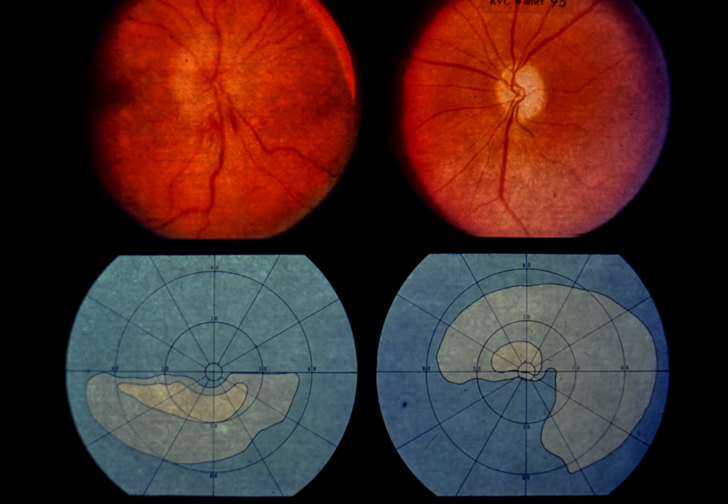Slide 95, Quiz 2. This 68-year-old female complained of sudden visual loss in her right eye. A similar loss of vision occurred 2 months ago in her left eye. Visual acuity is 20/200 right eye and 20/400 left eye. Color vision is abnormal bilaterally, and there is a left afferent pupillary defect. The optic discs are shown above, and the visual fields below.